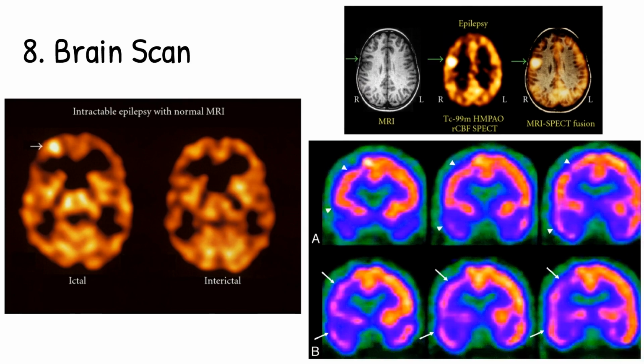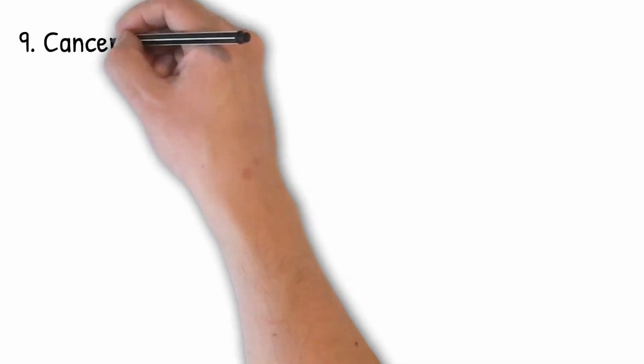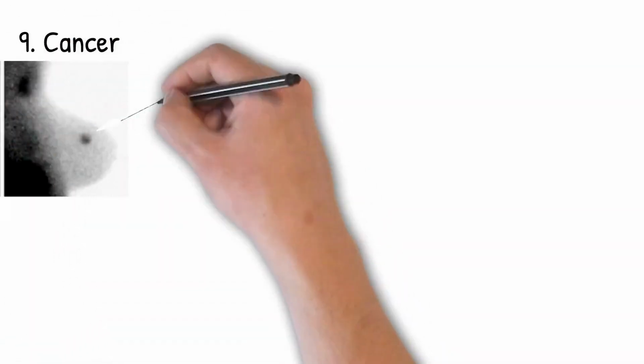Of course, we can do other things. Here's a patient with ischemia of the brain, transient ischemic attacks, associated with a stress test of the brain using Diamox. There's a huge range of different studies that we perform in cancer. This one is looking at breast cancer using a radiopharmaceutical. You see the breast cancer there with the arrow.